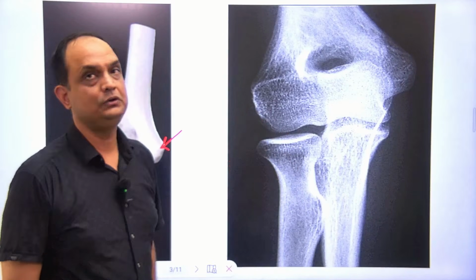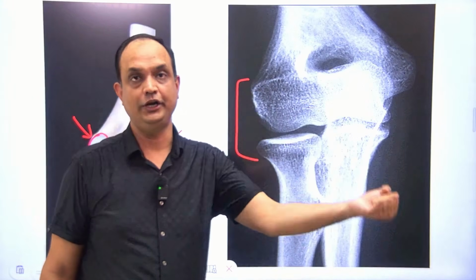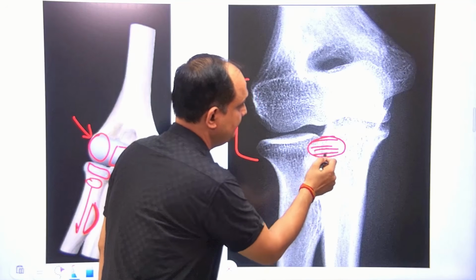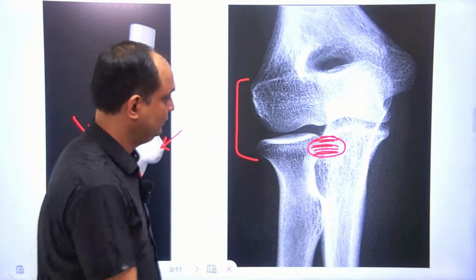Now the most common question is, what type of joint is visible here? This elbow joint is a classical hinge joint. Apart from that, this is your superior radio-ulnar joint between the radius and ulna, and it is a pivot variety of joint. What other questions may you have? What is this?